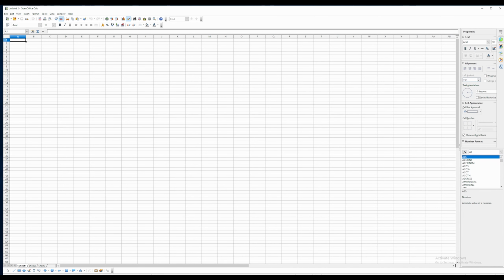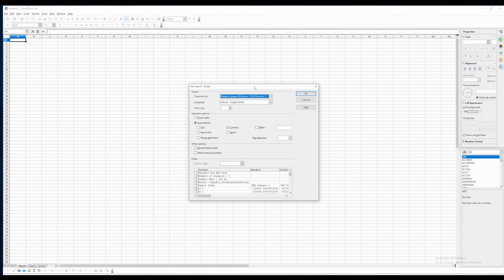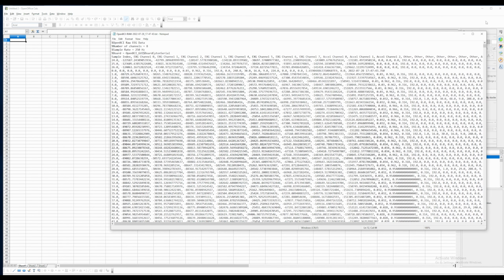Let's go ahead and look at our file. When you open a CSV file in most spreadsheet programs, it often asks you to designate how each column is separated by. Although the file might be CSV and it could assume that it's going to be separated by a comma, it can also be separated by other characters such as a tab. So if you actually record a raw file through the OpenBCI GUI, it gives you this text file, which is the one that we're working on.